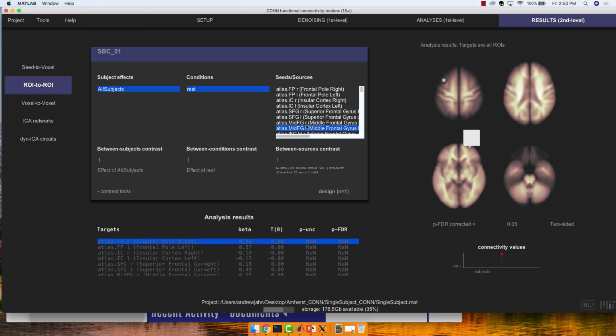Okay. So those are the basics of the pre-processing, and the Q&A. Now, just to get things started, I'm going to have everybody do the group level analysis.